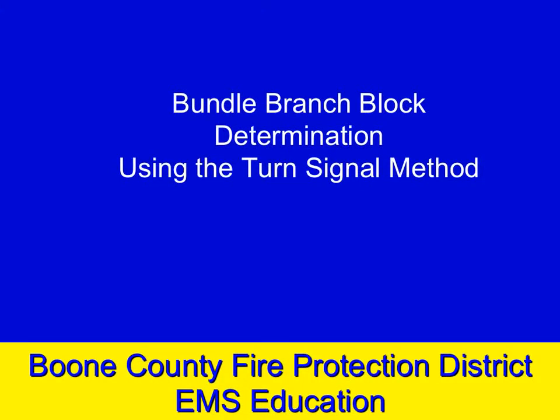This short presentation is focused simply on determining whether a bundle branch block is a left bundle branch block or a right bundle branch block. We're not going to concern ourselves with why a bundle branch would block or what that means to us. We're simply deciding left from right using the turn signal method.